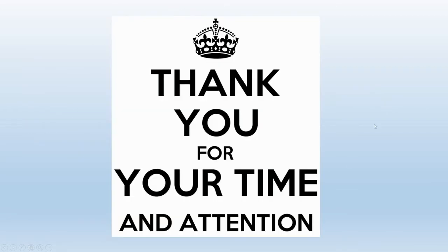I hope this video will be useful for you. Don't get discouraged and frustrated when you're trying to assess the abdominal X-ray. Just stay calm, have your structure that is good for you. You can use this one that I presented here, ABBC, or you can use another one. Just keep with that structure, and the more abdominal X-rays you assess, the better you'll become at it.